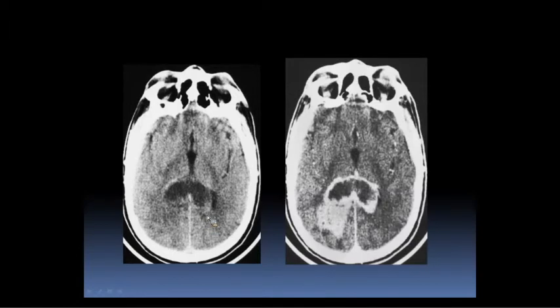And here we have contrast. We see that there's peripheral enhancement, there's central necrosis, there is a mural nodule here, and there is a big nodule, and you can see on the non-contrast, you couldn't even tell that there was a lesion there. So some lesions you really only see with contrast on CT. So what do we think this is? Any thoughts?